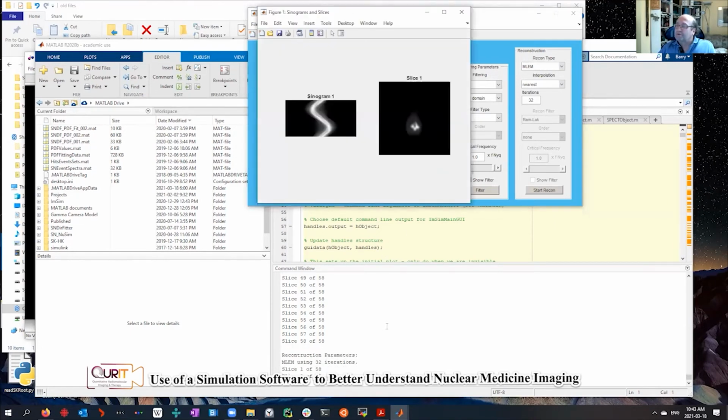And so we're reconstructing. Here I'm showing you the individual ones. See how much longer it takes to reconstruct the slices? I shouldn't have chosen so many. But this is actually a good example of just the basic relationship.